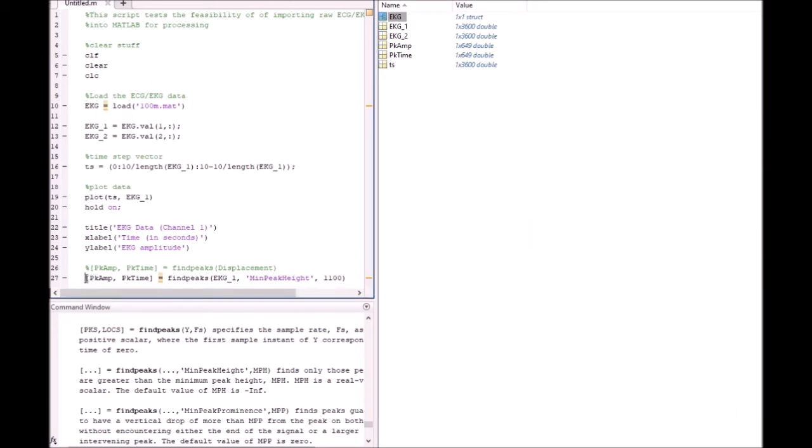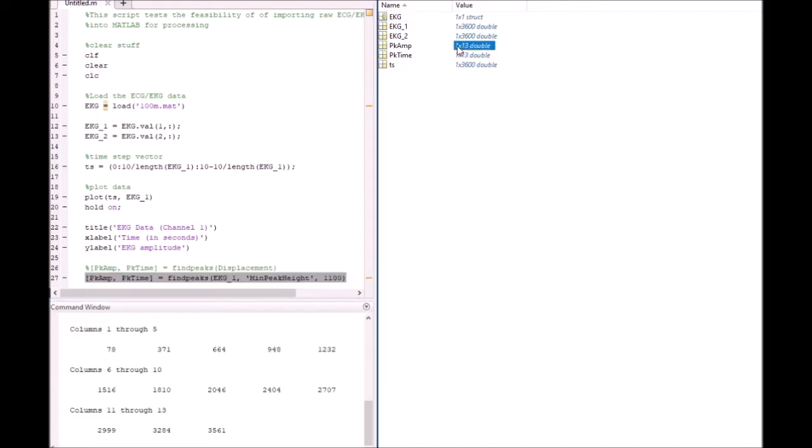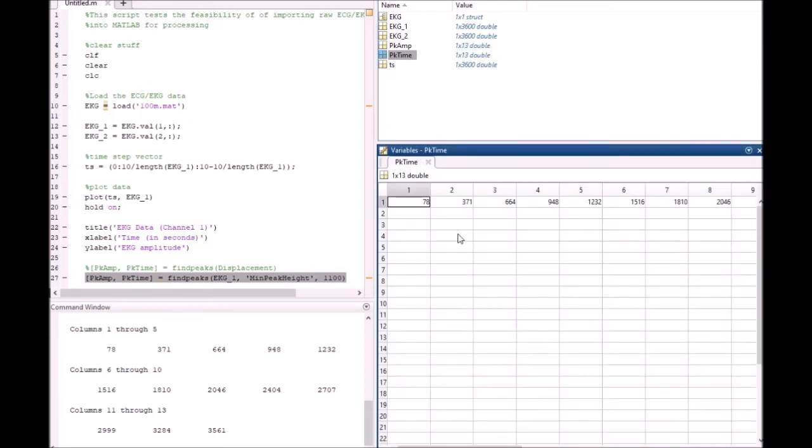So yeah, anyways, PK app. So this is what we're going to do. We're going to run it and we'll see what we get. Oh, 13. There you go. 13. And now we can see where the times are for these. And this is time.